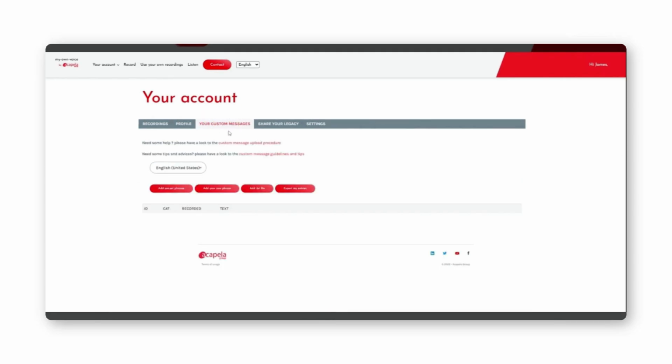Next, your custom messages. Here's where your patient can create up to 300 personalized phrases. This is optional. These might be useful requests or signature sayings like, "Good morning, pumpkin." We'll get into this one in more detail soon.